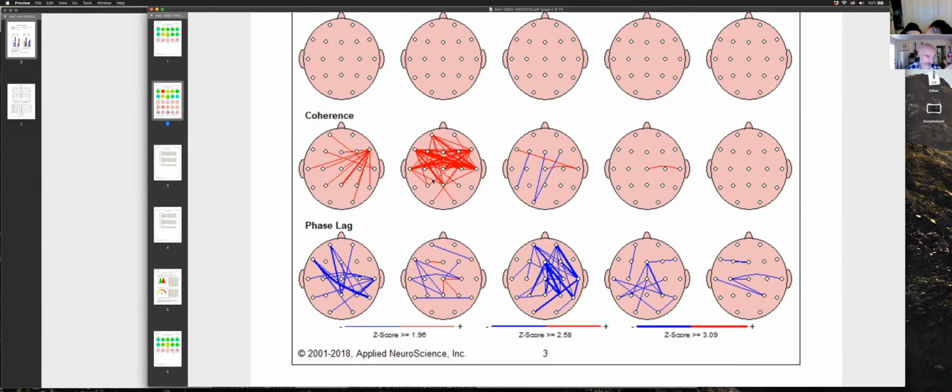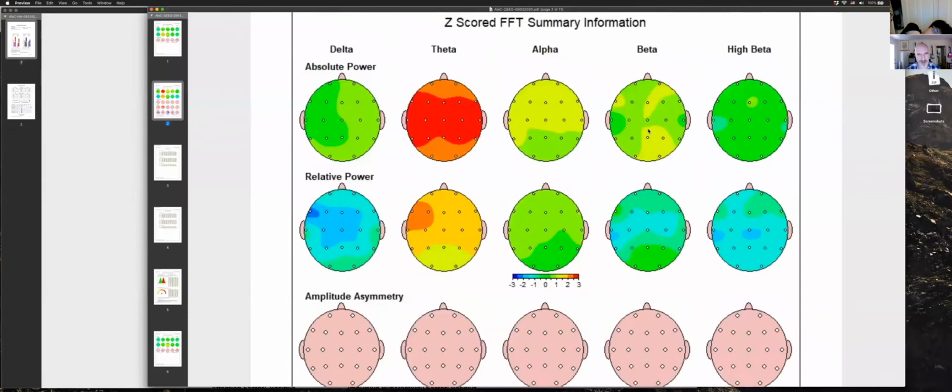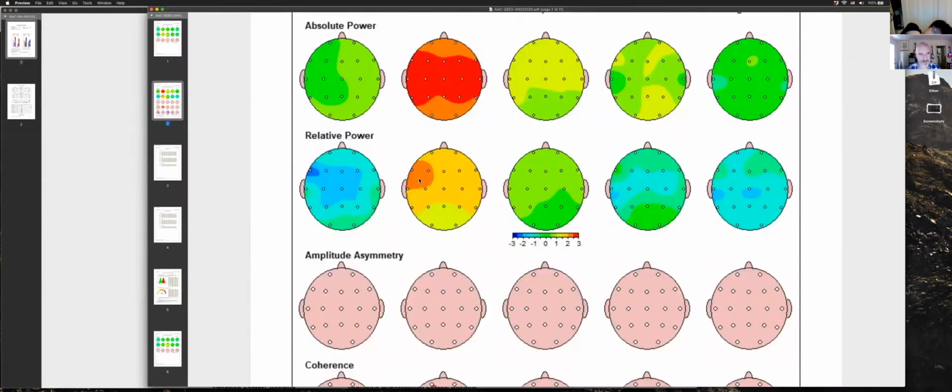And it looks like you cranked your brain up a little bit and you're stressing and selecting things with your mind in the front middle to kind of cut through the fog a little bit. And that leaves you very worried, because you're caught in an activated mode for a long time. And the last thing to guess from this page is you have some theta that's especially high and some alpha that's a little bit high on the left front of the head.